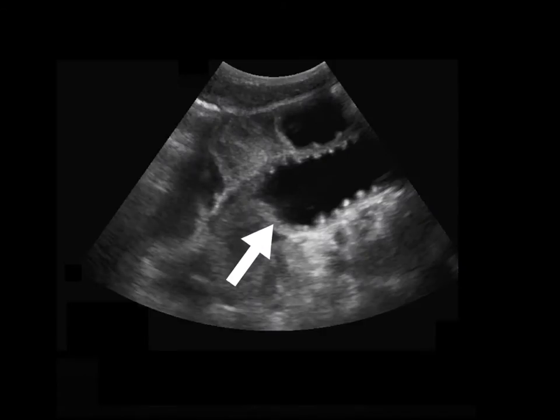So again, this is an image of a small bowel obstruction. And what you'll note are these very dilated, fluid-filled loops of bowel. Here you have one loop of bowel that has both fluid and solid fecal material, and then another loop of bowel, and again the same thing. Here you've got a fluid-filled loop with solid material posteriorly, and you can also see the little plica circularis of the small bowel. Essentially what you'll do is measure from top to bottom of this loop of bowel, and if it's greater than 2.5 centimeters, it's certainly concerning for a small bowel obstruction.